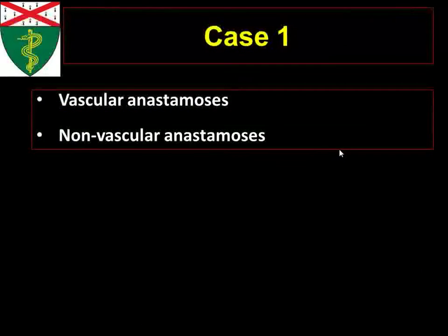So we have a bunch of residents here. Some have done ultrasound, some haven't done ultrasound. We'll go through some cases. Don't be afraid, we'll be fine. And let's start with the first case.